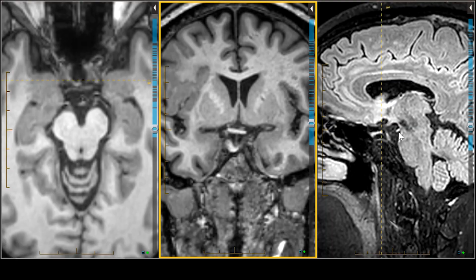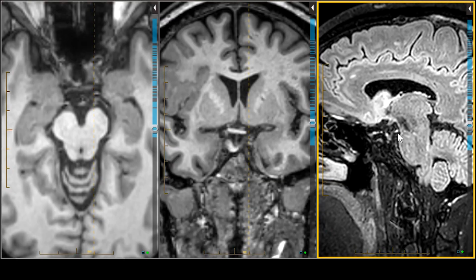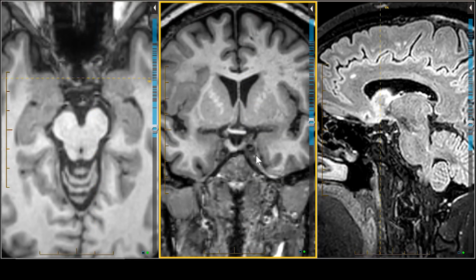In the sagittal projection, we already showed you the third nerve, which is probably the easiest projection to see it. Thin section imaging shows you the nerve in the interpeduncular cistern. One last caveat. What does the third nerve innervate? It innervates all the extraocular muscles except for two. The lateral rectus, which is innervated by the sixth, and the superior oblique, which is innervated by the fourth.